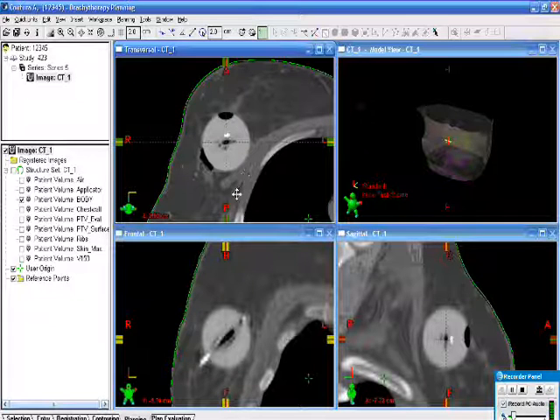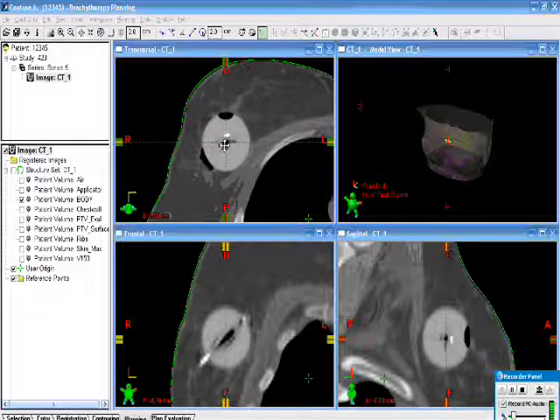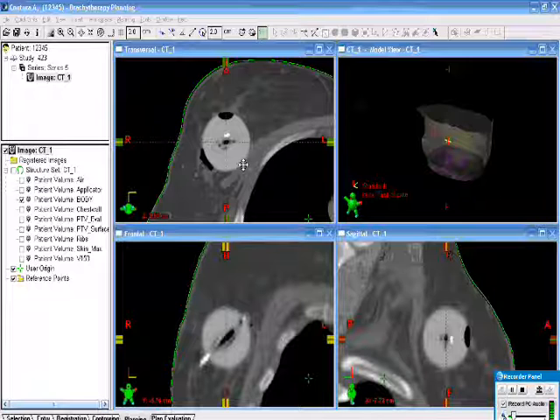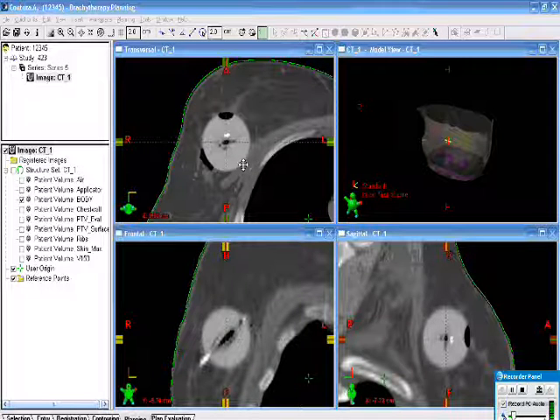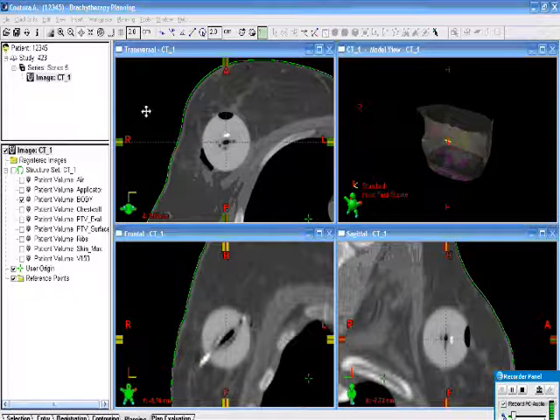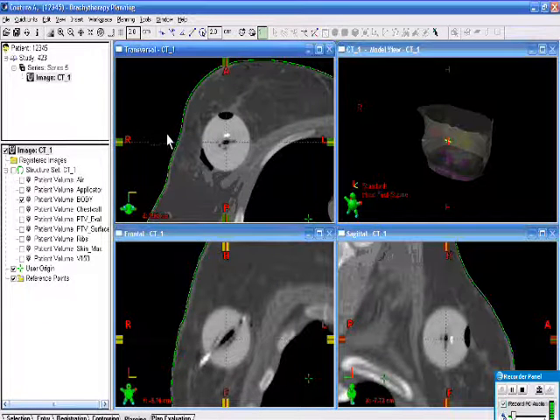Now what I will want to do then is to rotate the views such that the channels are visible in 2 views. We can get this with the Contura. Since there are 5 channels, it's possible to set up your views so that every single channel is available over its entire length in some view for reconstruction. So I'll go through that, and unfortunately I'm going to have to go through it again, because if you don't do this in exactly the right order in Brachyvision, it resets your views, and I'll illustrate that since I already blew it on that point anyhow.